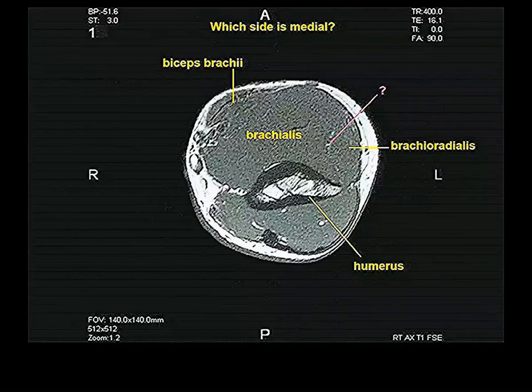This indicates something that is between brachioradialis and brachialis, and that much you should know. Something that is between brachioradialis and brachialis in the upper arm. This is the humerus here. It's a classic relationship. It'll be on the practical. Radial artery, not so much. No, radial artery comes off after the elbow, distal to the elbow.